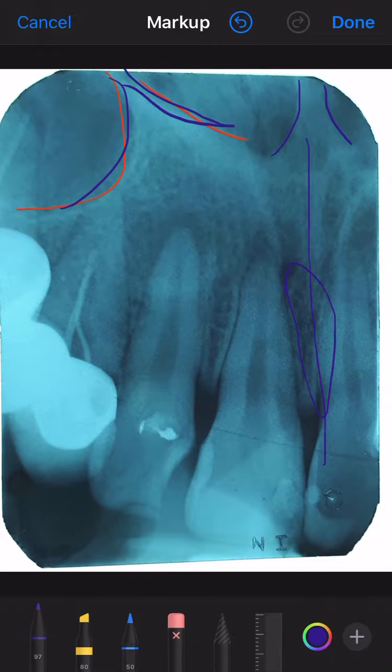Anterior nasal spine. Okay, nasal spine again. Somewhere there. Yes. More likely that it is a little lower than that. That is the nasal spine. So you should remember that it's not exactly that. That's the nasal spine. Okay. Fine. Now let's move on.